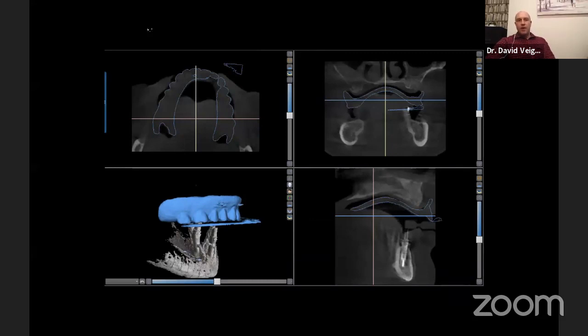This is what I was talking about earlier about the denture sitting on the bite frame. And what's happened, if you look in the lower right-hand side quadrant there, if you look at the blue outline, you can see it's raised off the palate. So what's happened is the denture has tipped because the patient was biting anteriorly on that bite fork. Now, if you didn't pick that up, you would go and fit your surgical guide, which would fit absolutely fine, but it would be in the wrong position relative to the patient. Okay.